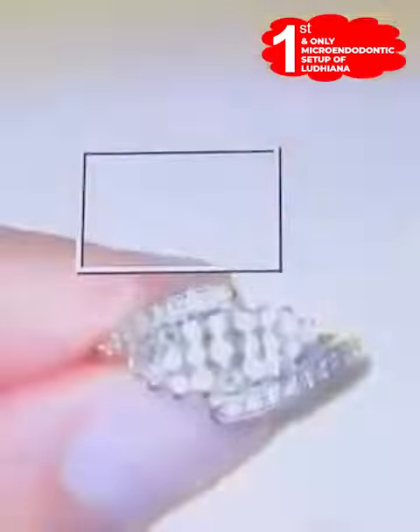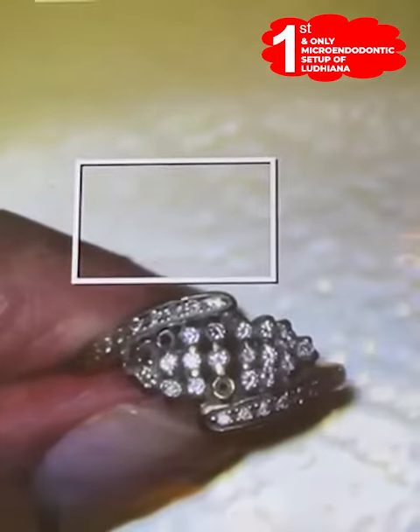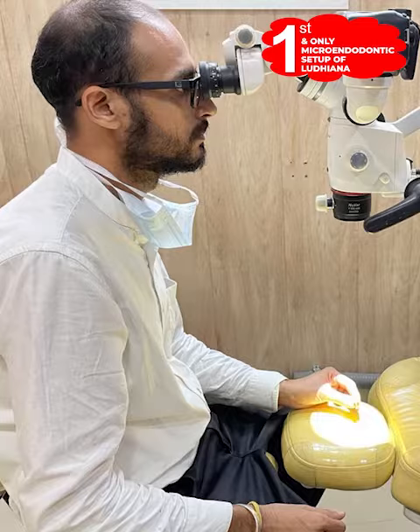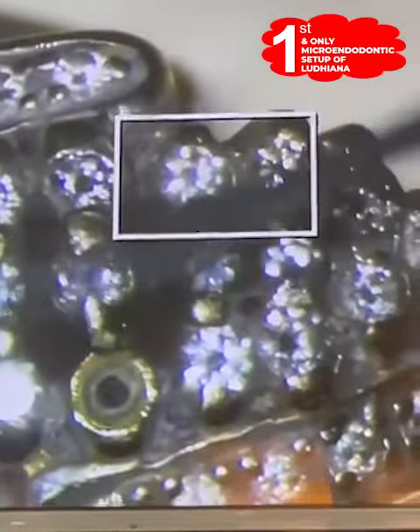If I increase the magnification, I can see 2 diamonds missing here. I can see fewer diamonds present and glittering. If I increase it further, I can see clearly what more are absent. And on the highest possible magnification, I can see the joints where the diamonds are connected. The missing diamonds and the connected diamonds. I can see every joint. It is possible for me to work on a single point.